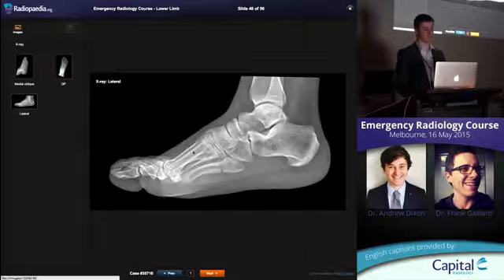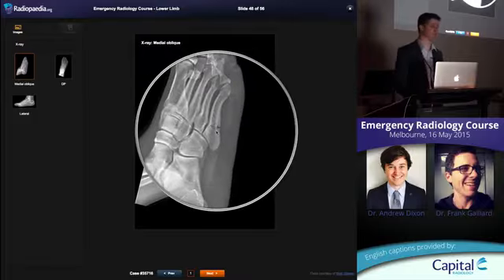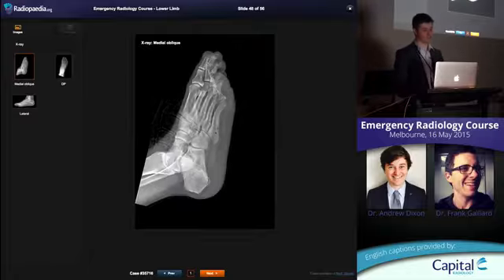All right. These ones, the Jones fractures, more so than the avulsion fractures, have a nasty habit of not uniting. Very, very common for these not to unite. So the surgeon may go in and stabilise this fracture. All right. So it's certainly worth getting serial follow-up films to look for non-union of these Jones fractures.